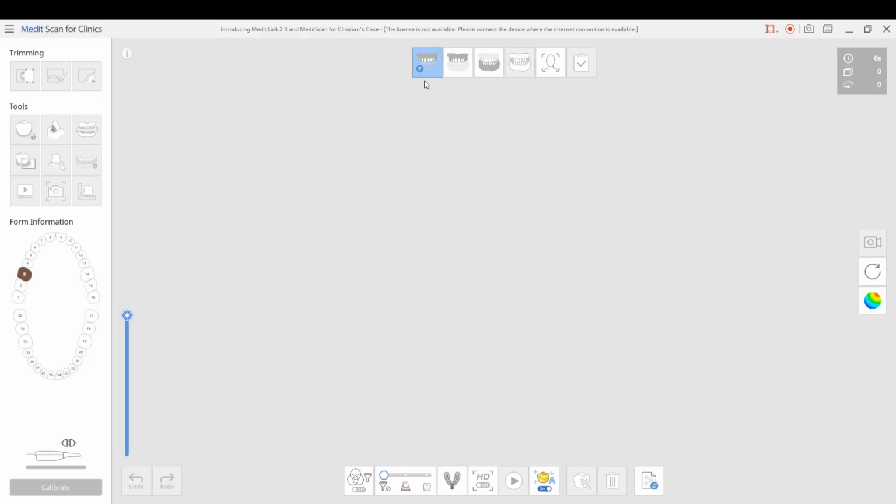So whatever you scan in the pre-op scan will be copied over to the jaw scan, and we'll show you how to use this where you can copy a pre-existing tooth or a crown that you love the shape of, or you have a denture that retrofits to that. You can scan the pre-op of that, scan the prep, and the lab or yourself can manufacture a copy of that pre-op condition and render a restoration that perfectly replicates what was there before.